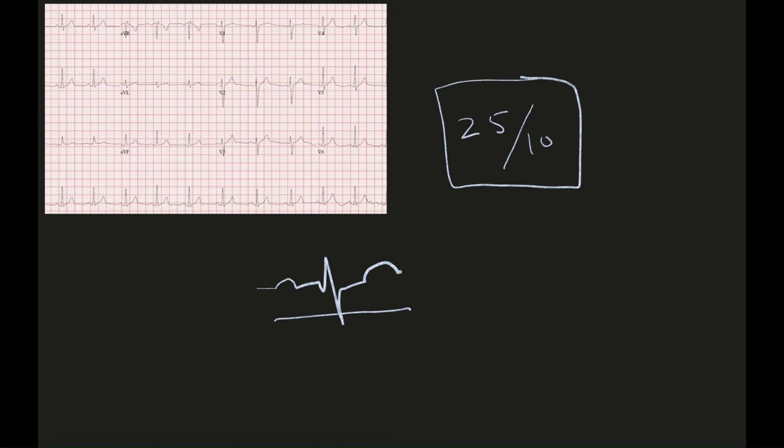If it is 25 by 5 or, for example, 20 by 10, the wave pattern will be different in that ECG. We can't really apply the criteria for hypertrophy and these things over that ECG. All the criteria that we will be applying are only applicable if your ECG is recorded at the speed of 25 by 10. Fine. Once you are sure about the speed, move on.